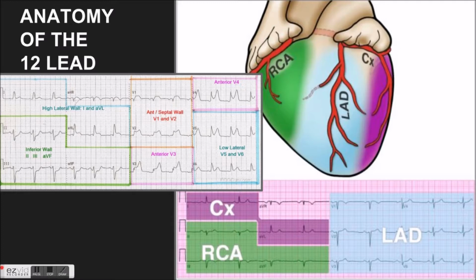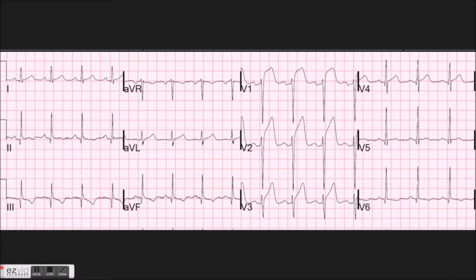All right, so we'll do one more after this. This is a particularly good one. Pause the video if you need to. All right, so this ECG is one of my favorites.